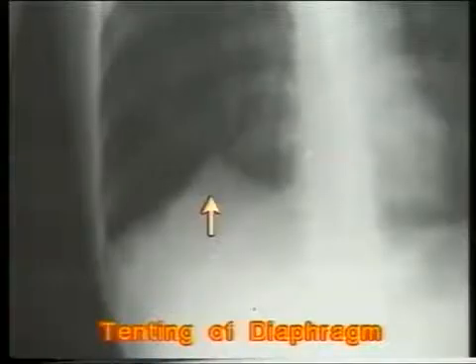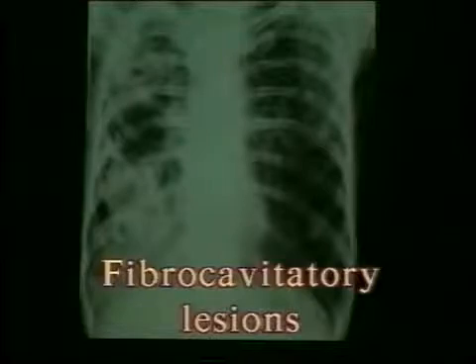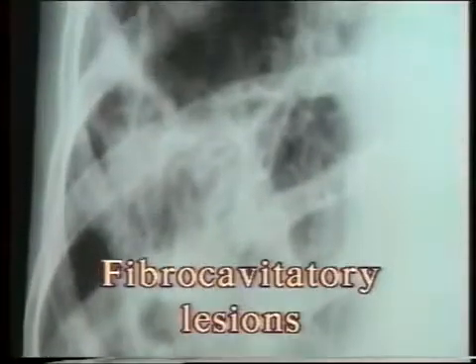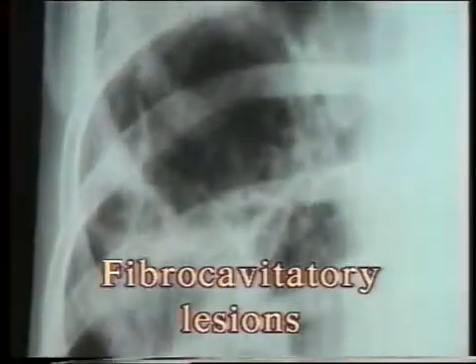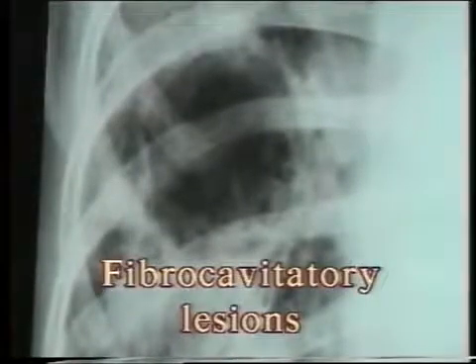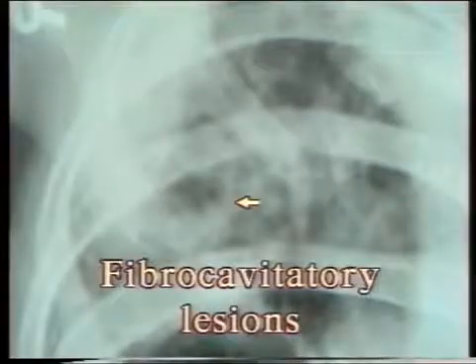In our country, very often, the tuberculous lesion is more advanced, more extensive, and is seen as a combination of fibrosis, infiltration and cavitation, termed as fibrocavitatory lesion. Note the thick-walled cavity and fibrosis in the right lower zone, a large thin-walled cavity in the mid-zone, and another small thick-walled cavity in the upper zone with extensive fibrosis.